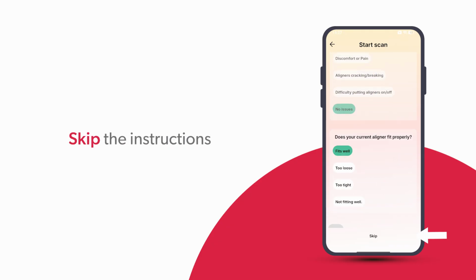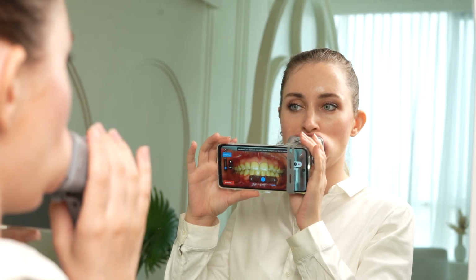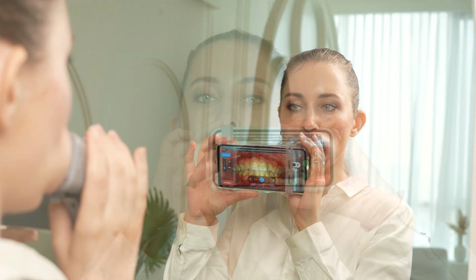Skip the instructions. Wear the iScope 360 and capture images in 5 different views. Once done, click on Request. The dentist will then have to accept your appointment request and confirm the appointment. During the call, your dentist will evaluate your teeth with the help of the uploaded images, perform their live AI analysis, and then plan the next steps in your treatment journey.